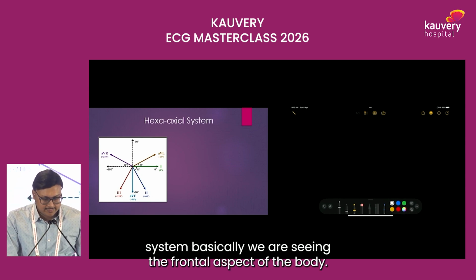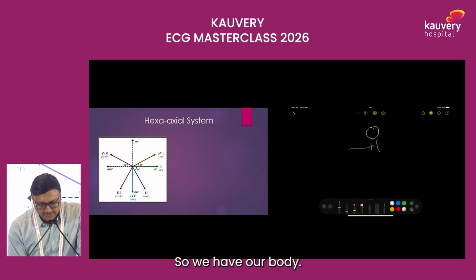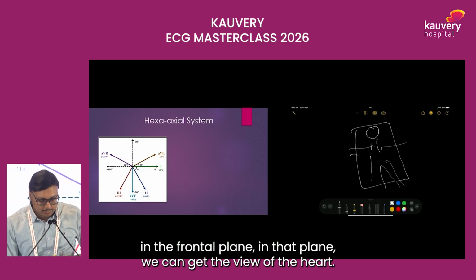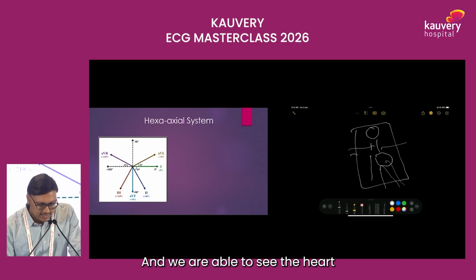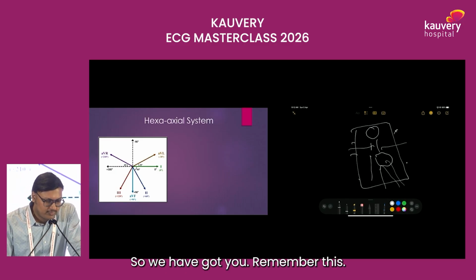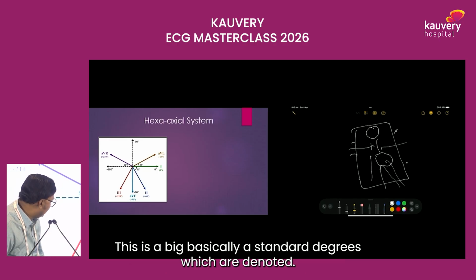Once we get this system, basically we are seeing the frontal aspect of the body. So we have our body, and if we have a plane that cuts through the center of the body in the frontal plane, in that plane we can get the view of the heart. The heart is here like this, and we are able to see the heart from various directions, as is seen in this hexaaxial system.